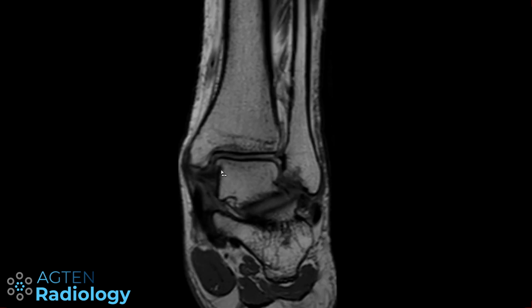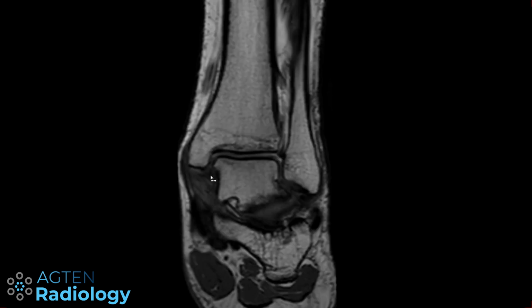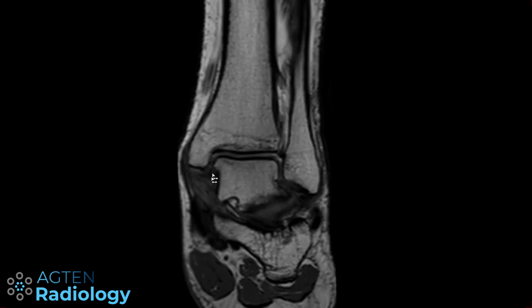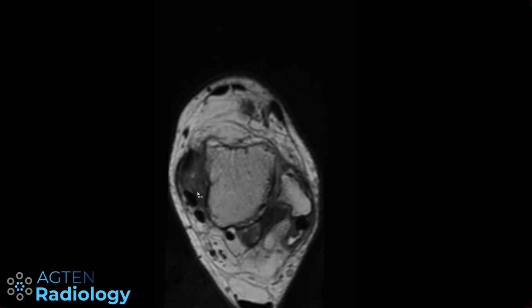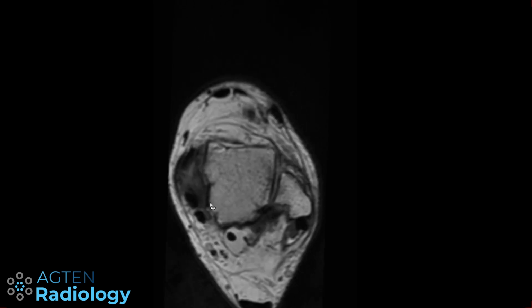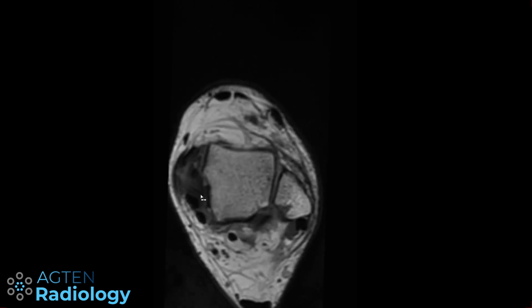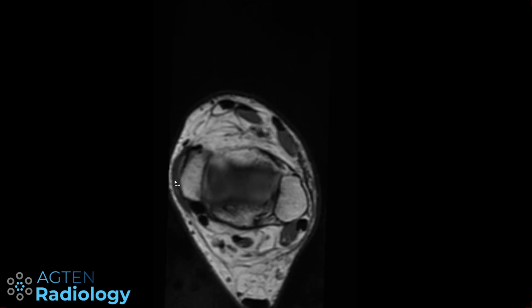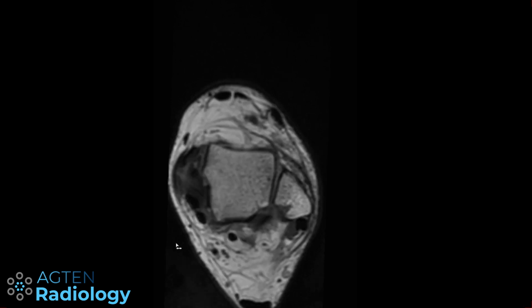So something like this is sometimes in literature also given as a potential reason for posteromedial ankle impingement. Because if you look here on the transverse sections, you have this kind of scar tissue here that can actually get impinged. So just to keep that in mind. But again, I think the literature is not really good. So I think one of the main issues is this fascial sleeve avulsion here.